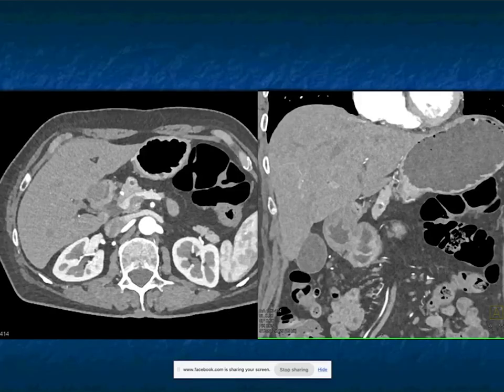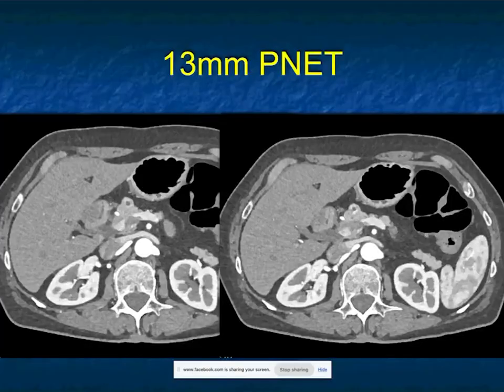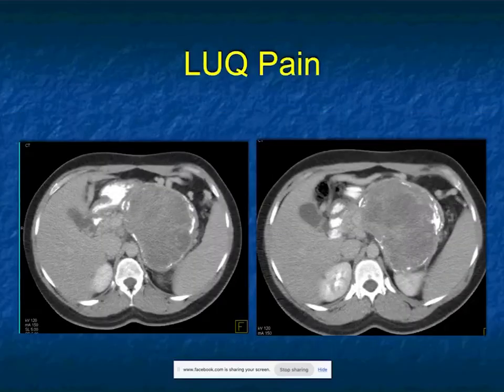It's small, as I said a centimeter, but it was actually 13 millimeters. What could this be? Vascular lesion, small? If the whole thing enhanced, you wouldn't think twice, and you would simply say that this was a neuroendocrine tumor. And in fact, this ended up being a neuroendocrine tumor. What was unusual was the fact centrally there was nothing special to explain this on the patient's pathology.